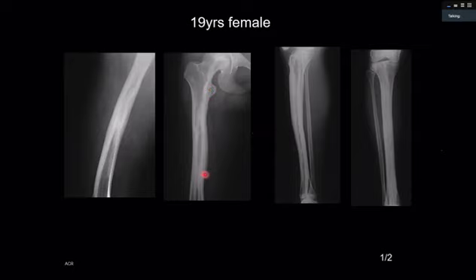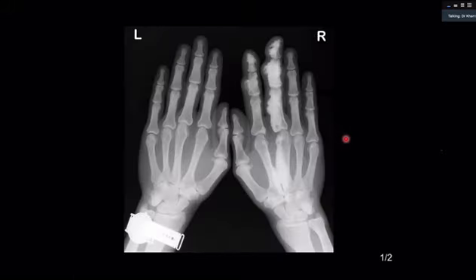to give you this molten wax type of classical appearance. If you look at this case, look at the tibia, and again, you can see this particular type of pattern. So this is melorheostosis, and I will show you a few further cases here as examples.